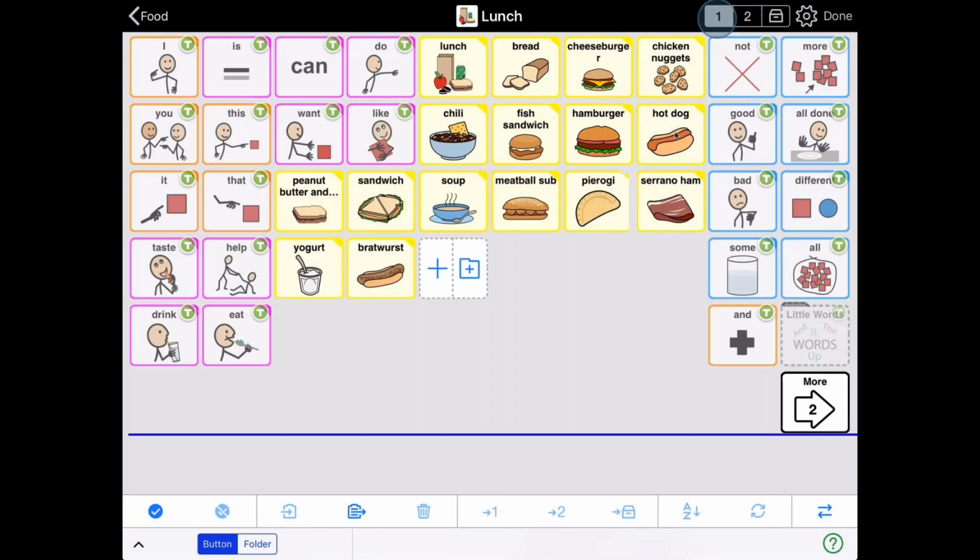So what you can do is go through these various folders with the person, with your child or son or daughter, or with the student you're working with, and they can help you do this kind of sorting of things I love, things that are okay, and things that I just don't want to have anything to do with.